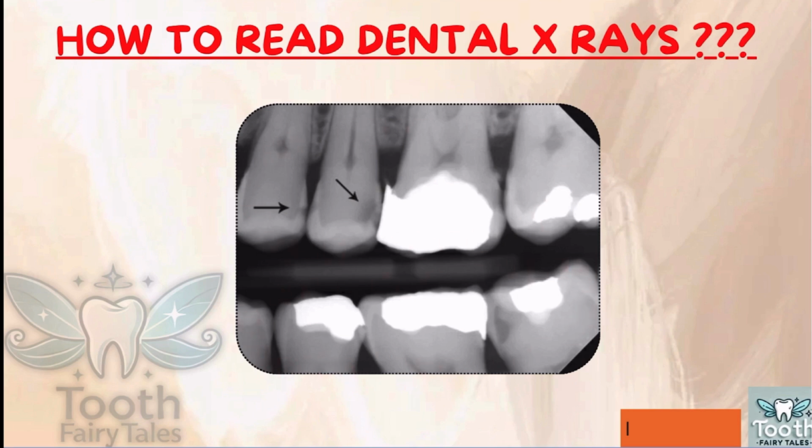Let's talk about the shadows and white structures we see here. Let's begin with this shadow here. This is called dental caries, and the layman term is a cavity. You can see similar shadows here. And these x-rays are very valuable in determining cavities in between the teeth, as they are very hard to see with the eyes. And there is one more here.